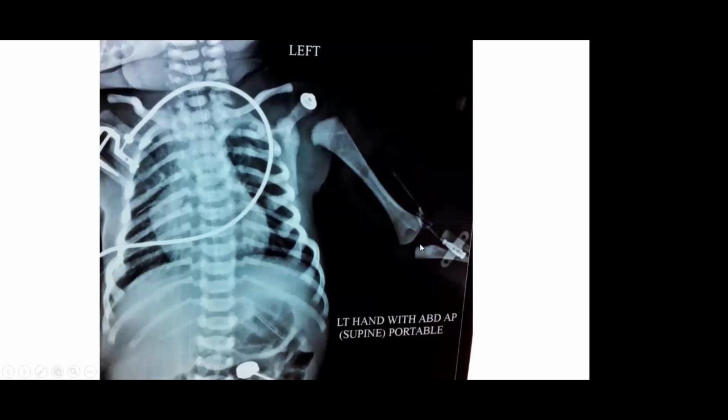Look at this PICC line. This Ladder flex. I don't know how I managed to create this, but there is a true knot here. How did I create a true knot here? These are the diagnoses which we call GOK, that is God Only Knows. So this is the GOK complication.